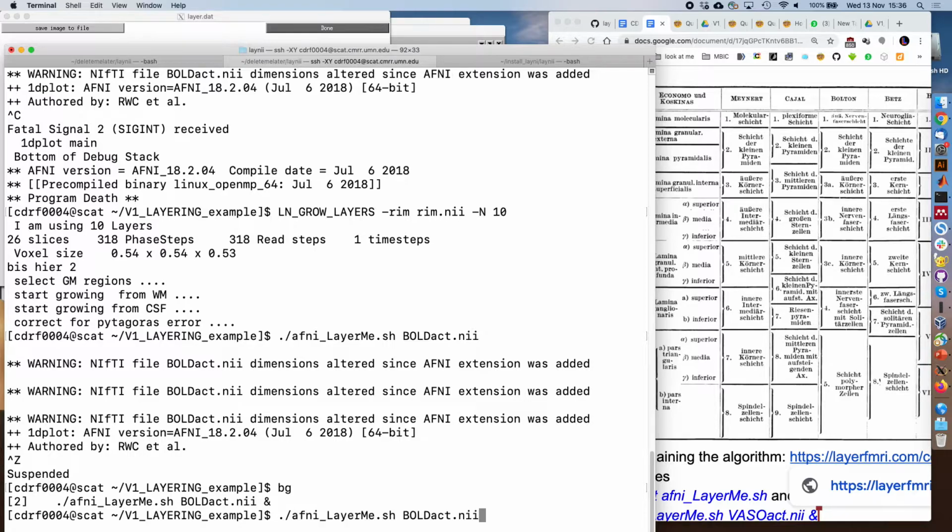Yes? I think I don't have the AFNI environment set up. Do you have the Google Docs? If you scroll up a bit, the other direction, sorry. Go further down. There, the AFNI would be this path, and then you can do AFNI. I think you need the entire thing. This is actually one line. It's weird that you don't have it. I did this 3dcopy, but I can't run the script. It happened to me too when I tested it this morning. Oh, the paths are weird. It's annoying. I'm not sure what's happening.